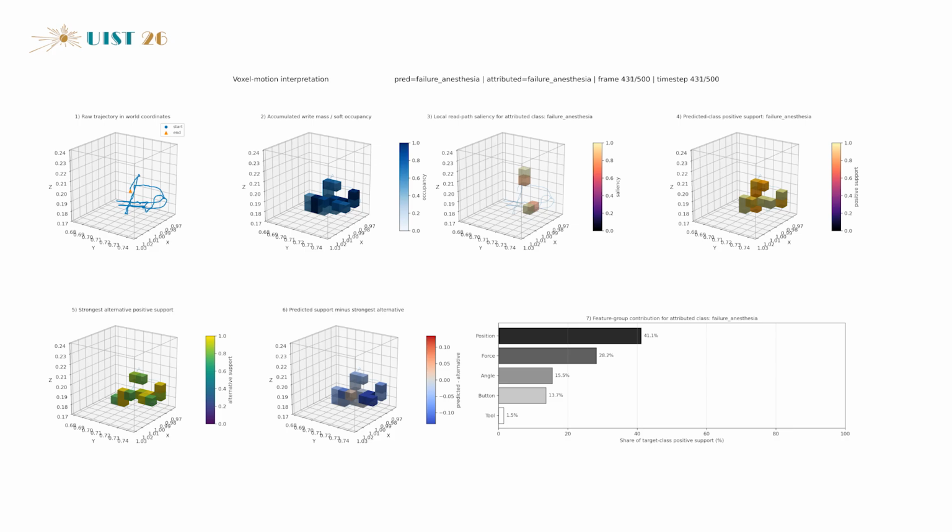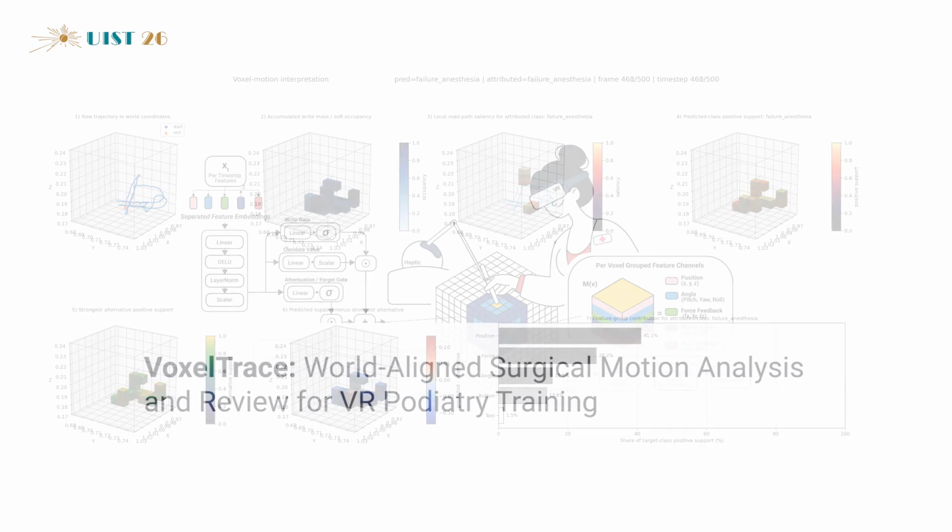In initial feedback, a podiatry doctor noted that these voxel representations align with procedural expectations, localize meaningful surgical behavior, and could help support trainee feedback when compared with expert baselines. They also noted that guided explanation would help first-time users interpret the VoxelTrace visualization.